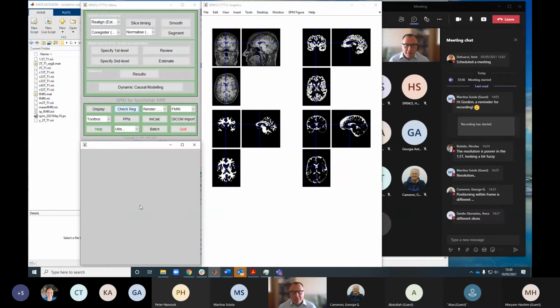So we have that mapping from our structural image to the template space. Now we need to apply that same mapping to our functional data, so that our functional data can be mapped from participant space again into template space. Template space is important, as I said, because it allows us to compare our results with other people.